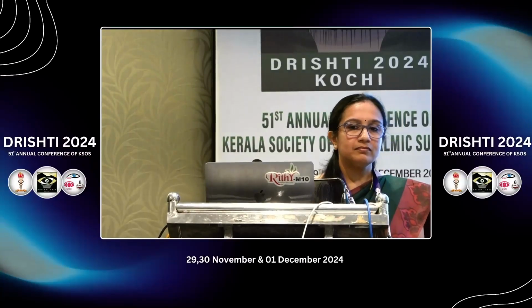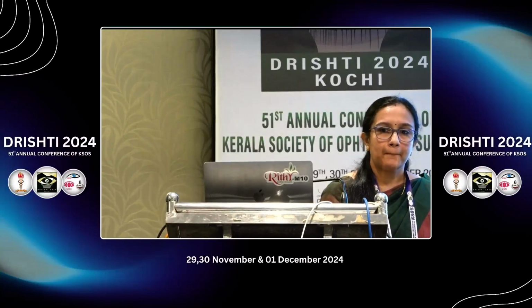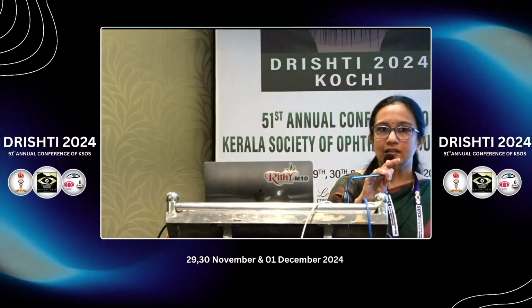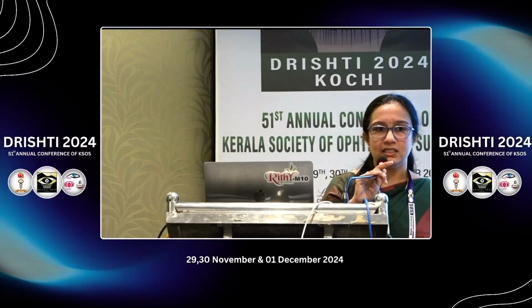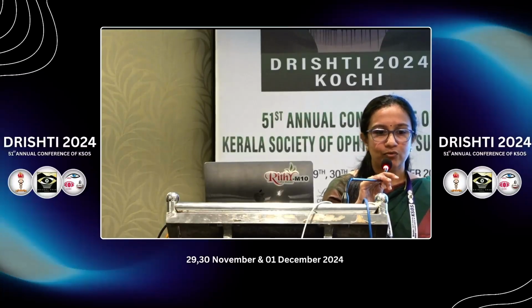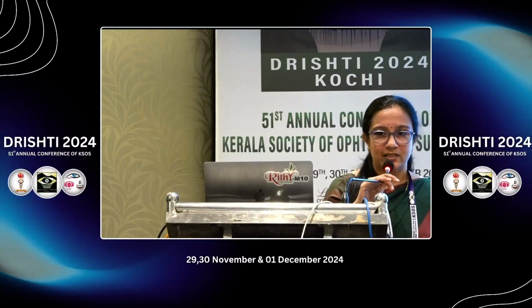OCT or OCTA. In a busy practice, very often we do not have time to go and check. But like Madam said, all that segmentation is very important. And scrolling through the images that have been taken helps us to identify a lot more things that we might miss by just looking at a final printout. In fact, the morphology is more important than the quantitative analysis. So most often we look at central macular thickness. It is actually overestimated, but morphology of the edema will be more important. The biomarkers are more important than the actual measurements.